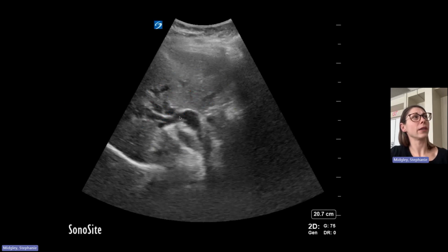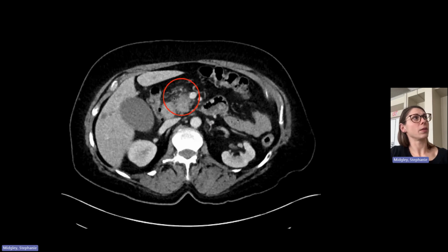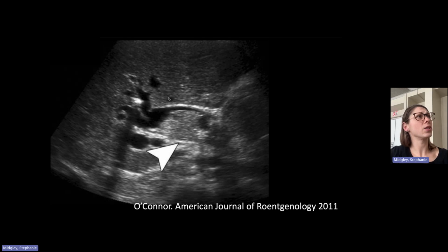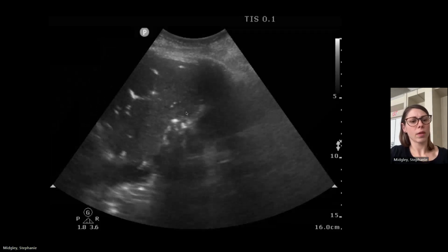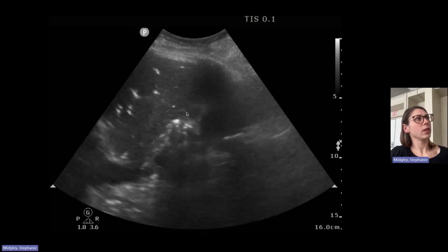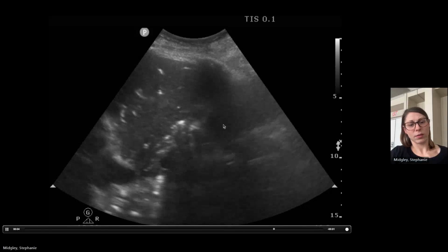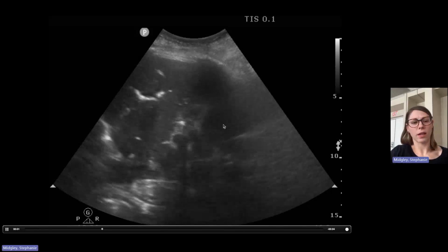Have you ever heard they call it the antler sign because it looks like antlers from a deer. Right, so that was this patient's CAT scan. You can see this is all his biliary dilatation. And it was from his pancreatic head tumor. Other things that can do it is cholangiocarcinoma. And then rounding out the last of the bile stuff, what do you think this is? Yep, yeah, so you got pneumobilia.